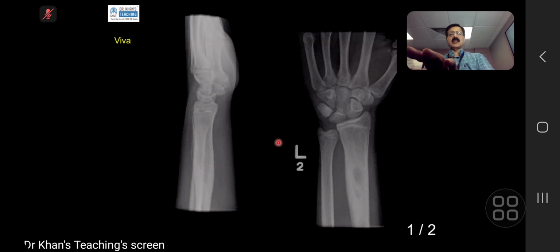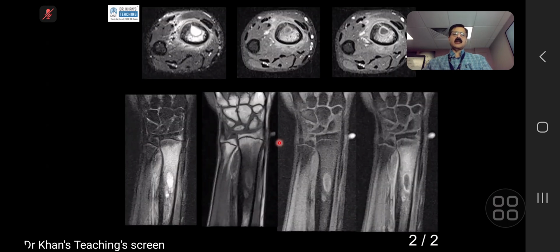So this is the case which we did see initially when I was showing you MR of MSK. And here, this is a T1 weighted sequence. This is a STIR sequence. This is a T1 fat saturated, T1 post contrast fat saturated. This is pre, this is post. So you can see the penumbra sign. Actually, this is one abscess and there is a satellite abscess here also, Brodie's abscess. A lot of edema, which is low on T1, high on the STIR sequence. And it shows enhancement, intraosseous abscess.